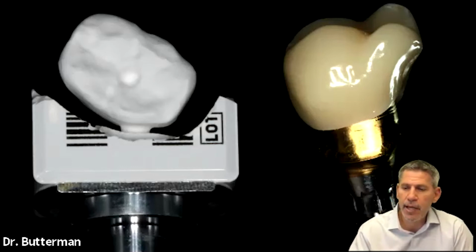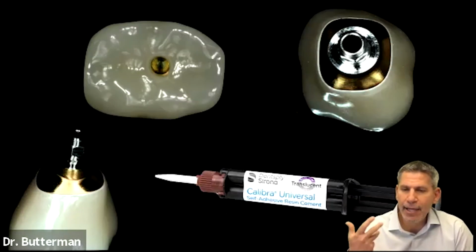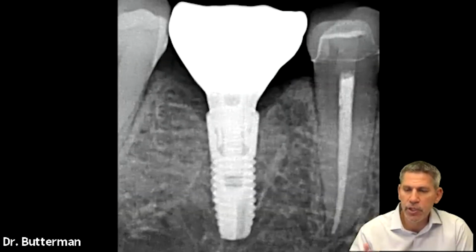And then directly behind me is the abutment that Atlantis made, and that comes again 48 hours later. I make the crown that comes on top of it, and then I'm just going to extraorally bond the crown to the abutment, and you can see our screw access hole ready to go. And then I can just deliver that entire complex to the patient, and we can get a good result.